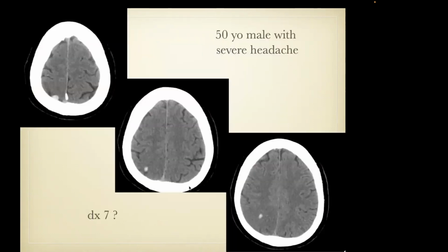This case, I think I touched on earlier. I just want to show you, you're not going to see this very often, but I want you to see it because if you ever see it again, you're going to know what it is. This was an unusual patient who came in and had this dense structure that seemed to be going through the hemisphere, sort of perpendicular. Notice it's high attenuation.